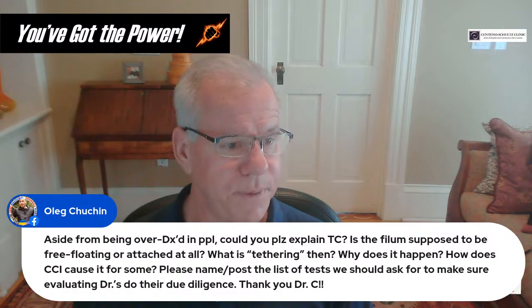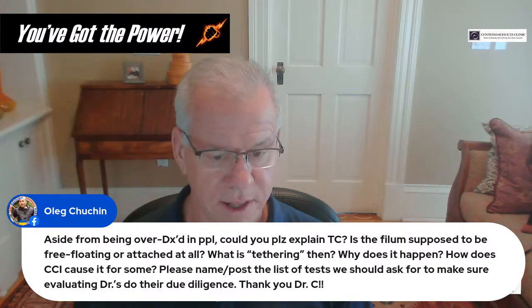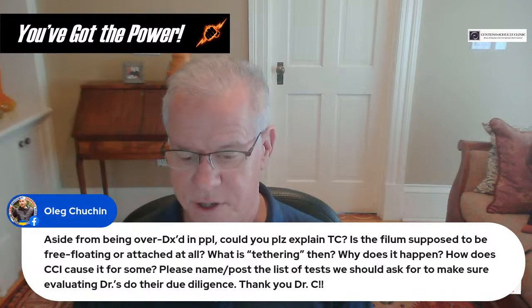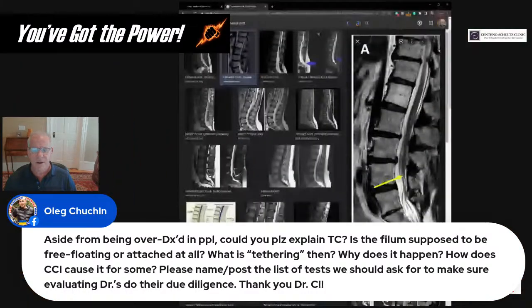let me see if I can find a good picture that shows you what a regular tethered cord looks like. Here we go. Let me share that. So here we have the usual tethered cord, not occult. Normally the end of the spinal cord stops way up here, but now we have a spinal cord ending way down here at L4-5. So that's the usual tethered cord.